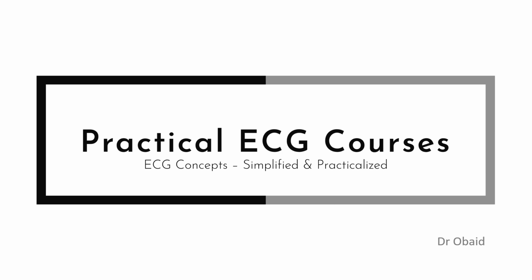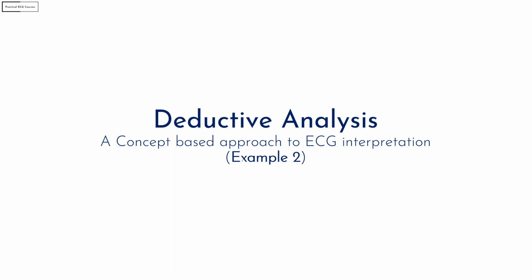Like I said in my previous video, there are two ways to interpret ECGs. The first method is pattern recognition, which is the most common method used to interpret ECGs. Basically, it involves recognizing some patterns on the ECG and making a diagnosis based on that. So, what happens with ECGs in which you do not recognize the patterns? This is where deductive analysis comes in.